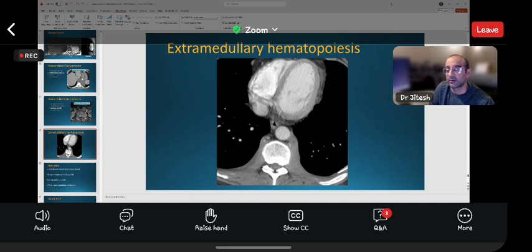If it's a neurogenic tumor, schwannomas and neurofibromas can extend to the neural foramen and go into the spinal canal, whereas ganglioneuromas or ganglioneuroblastomas are more in younger patients, more elongated, cylindrical-shaped tumors. But definitive diagnosis mostly comes from biopsy.